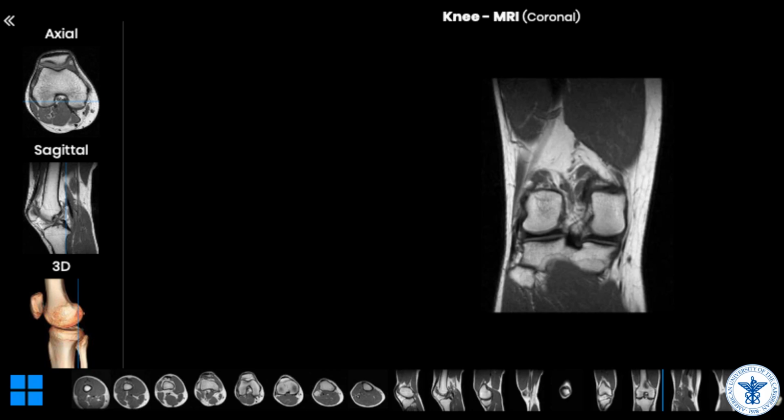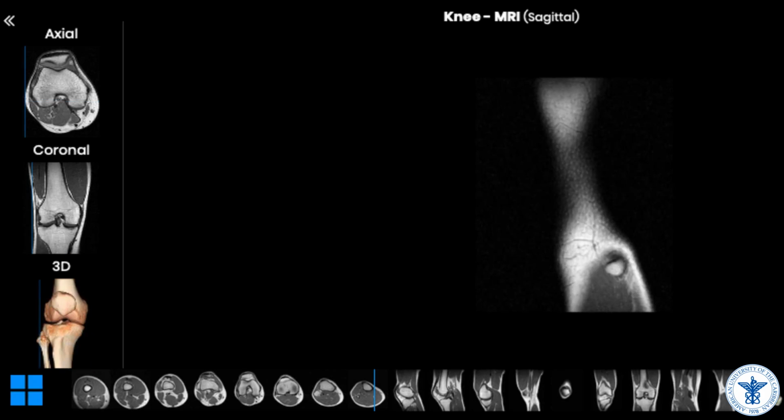But as you see, it has some space between the meniscus, the lateral meniscus, and the ligament itself. We have some space filled with connective tissue which appears like a whitish space between them, so they are not attached. At the sagittal views, it's quite useful to be able to recognize the head of the fibula. Here it is, this tiny piece of bone below. It shows us that we are looking from the lateral side to the medial side.